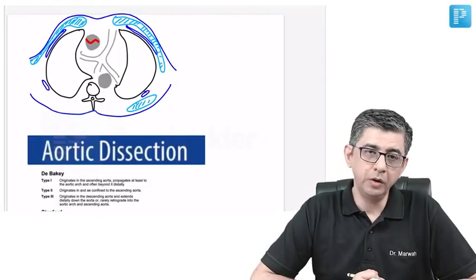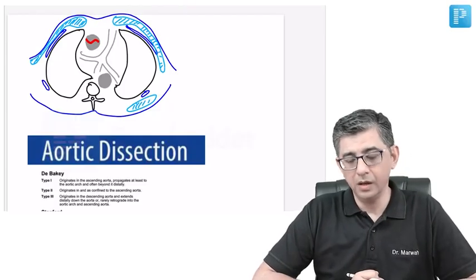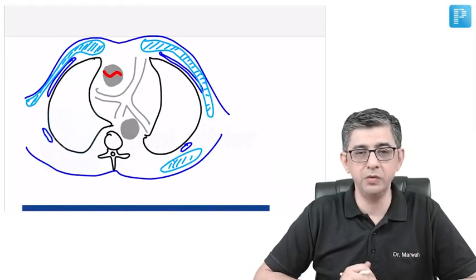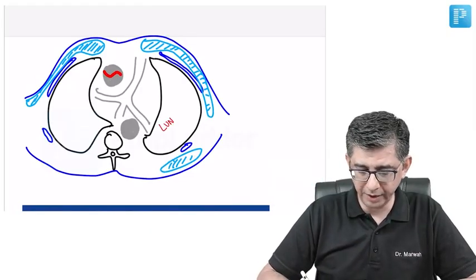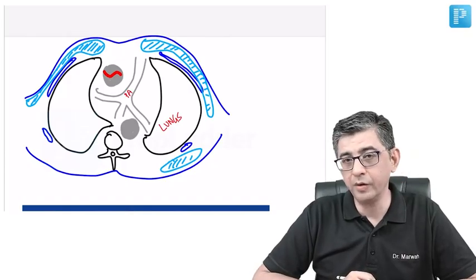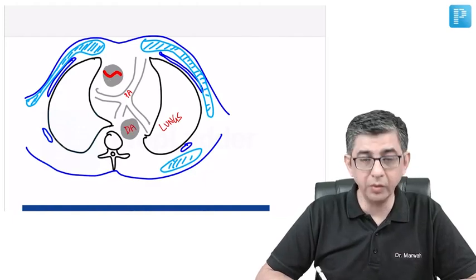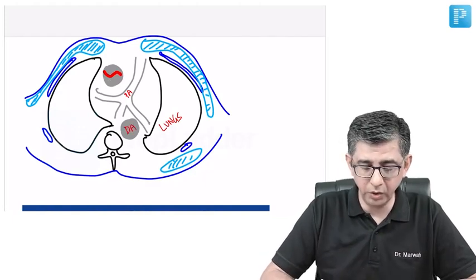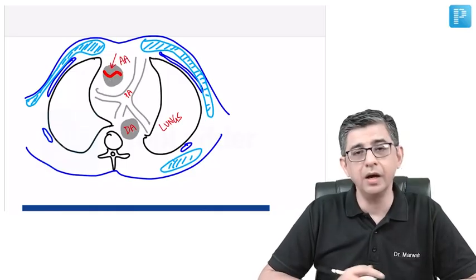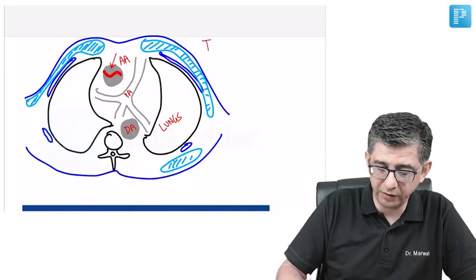Now coming to the subsequent topic, which is a disease of the aorta, aortic dissection has been asked. I'll just zoom into the image which I've hand drawn before you, and there was the CT chest of the individual given. You can pick up the lung architecture here. The blood vessel which is present, and I marked at the moment, is the pulmonary artery, and then it's bifurcating into the two. Posteriorly, you can see the descending aorta, and anteriorly, you can notice an intimal flap in the ascending aorta of the patient. And well, this tells you that this patient would be having a type A aortic dissection.